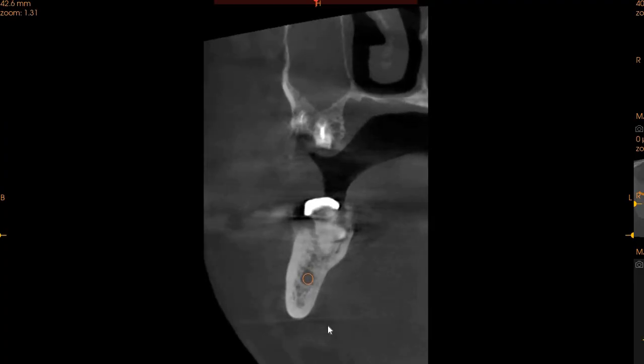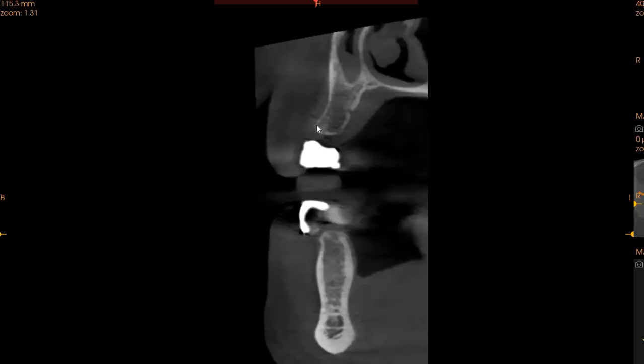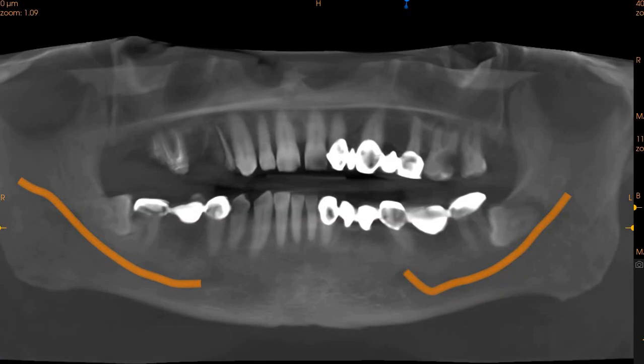severely cavitated underneath the bridge. If this tooth is to be extracted, we've got a bone quality of D1, ridge width of 12 millimeters and a height of 10 millimeters. This is the upper left 4. We've got 5 millimeters of width with 11 millimeters of height.